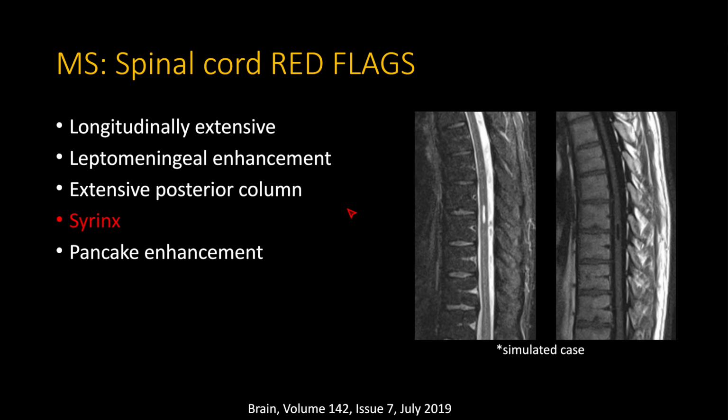Another one of these red flag type lesions is a syrinx. Now, syrinx typically is not a diagnostic dilemma, and what you need to know about it for imaging is that it's going to be CSF equivalent in signal. So on all your different pulse sequences, it's going to follow CSF. You can look at your CSF here. On this STIR, it's bright. This syrinx is going to be equally bright, and then on T1, it's dark, and this syrinx is equally dark.